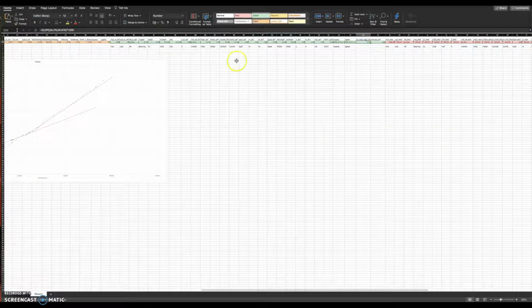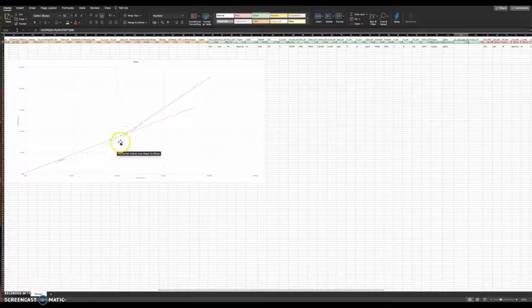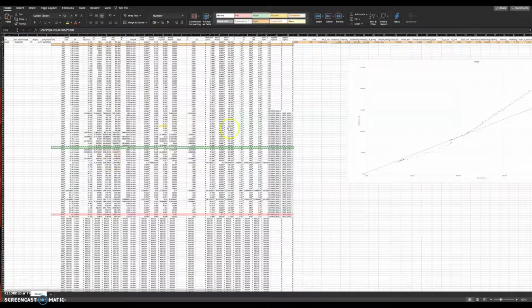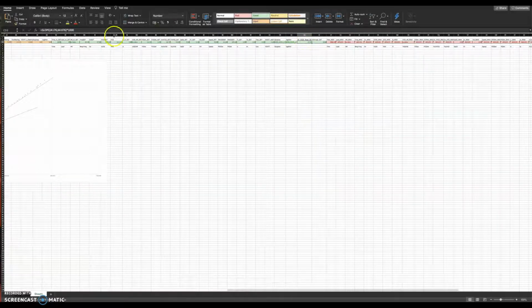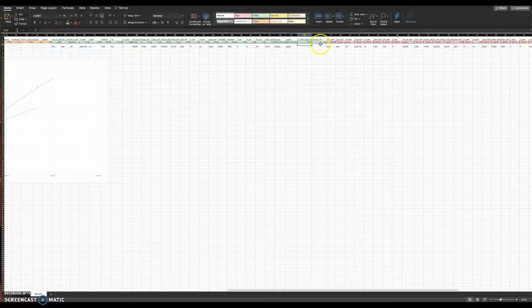And then we have to calculate the slope of that line. Now the slope of the line is basically the slope all the way up to this point here. So it's this first slope, before the kick, right? I need to enter the point at which the slope is stopping, and remember that's 52. So it's the slope of these two lines up to this point here, 52. Click into that, and let's change that from 76 to 52, and change this from 76 to 52. Click on enter. So that's the slope of that line up to that point.